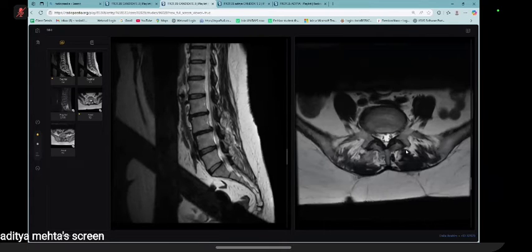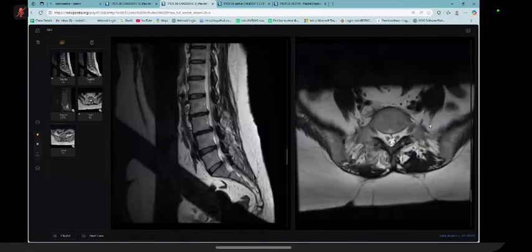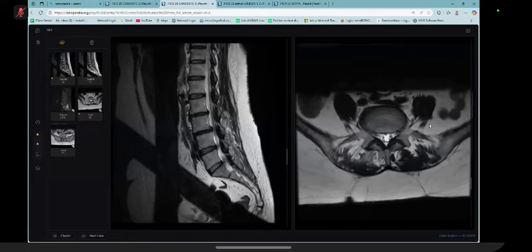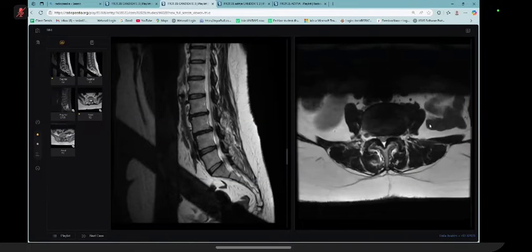Okay. Yeah, you can just take the axial cuts. I'm sorry we don't have that synchronization, but you just have a look. It's from down to upward. Here I think the level. Just one second. This is mostly the level. These two.